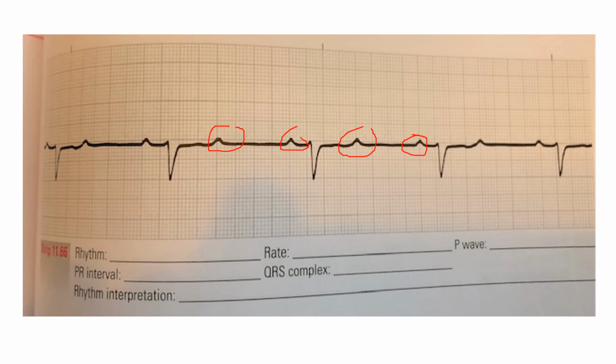Now if we have P waves, we can measure PR intervals. When measuring your PR intervals, again, you have to have a P and an R. With your PR interval, it is constant. It is 0.24 for all of these, so we know that it is constant. The QRS is a little wide, which can happen in higher grade blocks, 0.12 to 0.16.